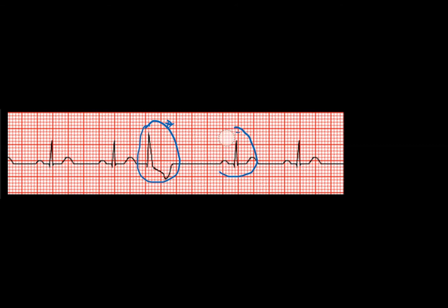So let's just go ahead and get rid of my little drawing here, my little circles. Okay. And let's bring in our calipers again, because we want to see whether or not this is something that is occurring frequently. Right, so we're going to line up.